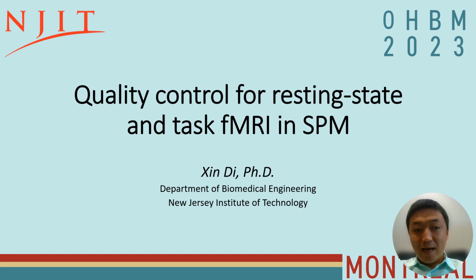Hello. Today I am going to talk about quality control for resting state and task fMRI in SPM.